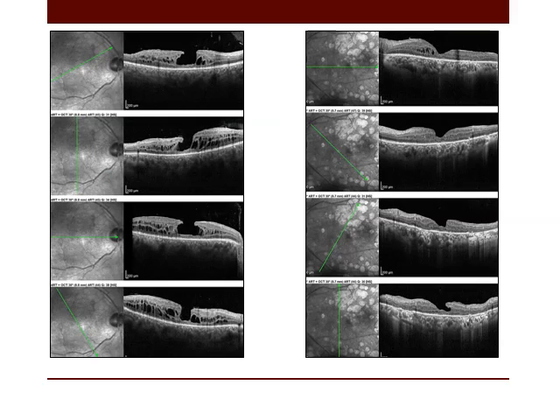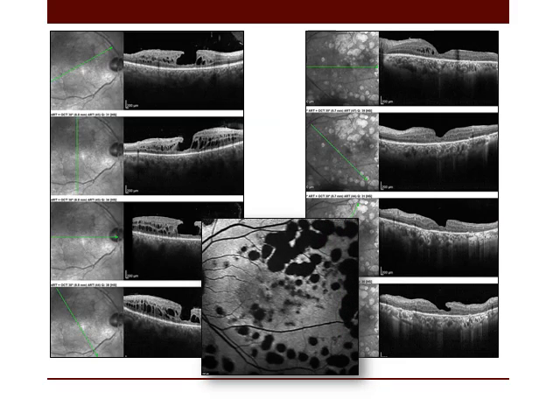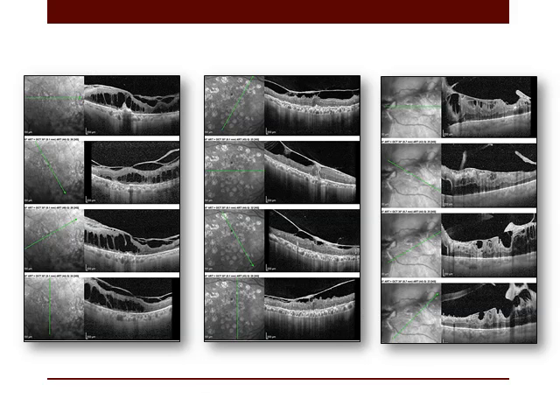Another example of vitreomacular interface abnormalities is the partial or lamellar macular hole and pseudo holes. Rupture of one of the cysts with the presence of epiretinal membrane gives you the lamellar and pseudo holes that usually exist together in the same patient. Another patient with lamellar macular hole and epiretinal membranes. Autofluorescence highlighted the presence of extensive retinal laser therapy that may be the reason for the vitreomacular interface abnormality.